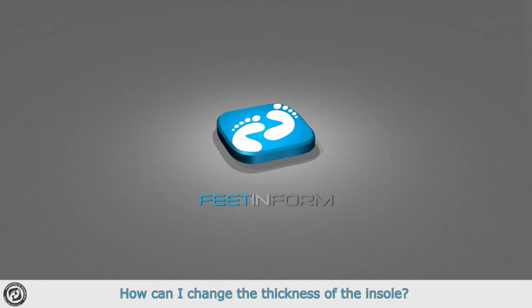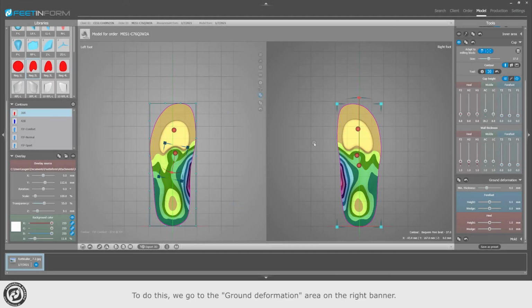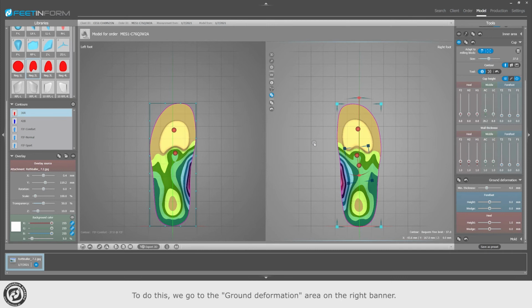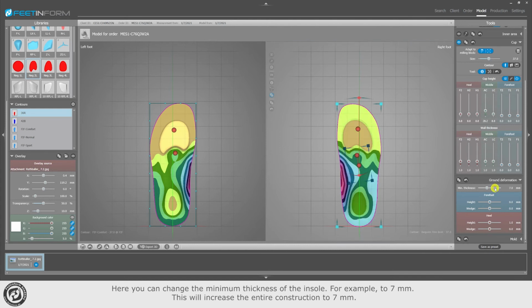How can I change the thickness of the insole? To do this, we go to the ground deformation area on the right banner. Here you can change the minimum thickness of the insole, for example to 7 mm. This will increase the entire construction to 7 mm. In the bottom work area, you will always see the coordinates of the mouse pointer. The Z value is the height at the point.